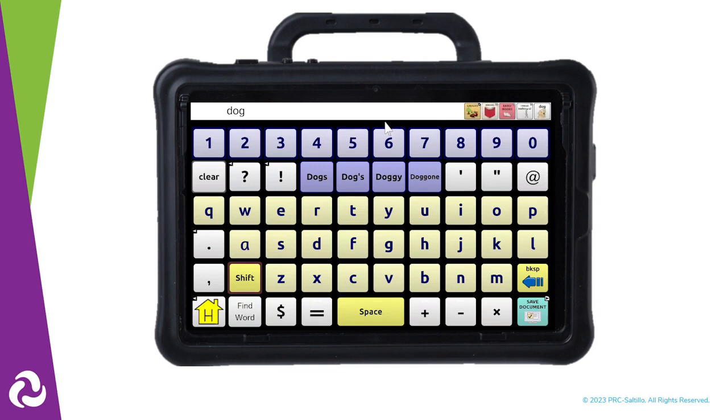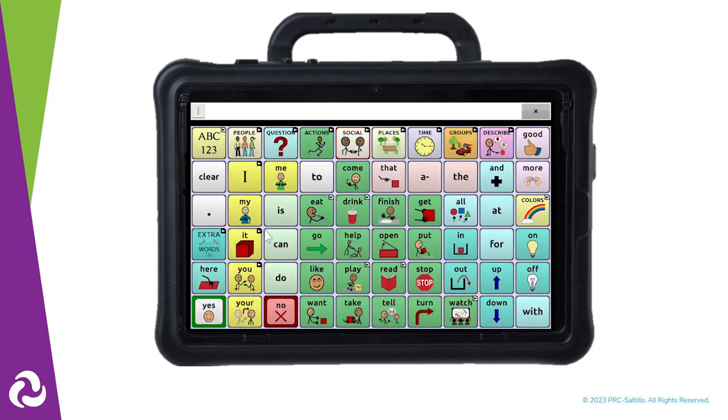If it's located in more than one spot, it will flip through those possible sequences as well. Most sequences are only a few button hits, and you'll be able to go to your vocabulary file and find them.